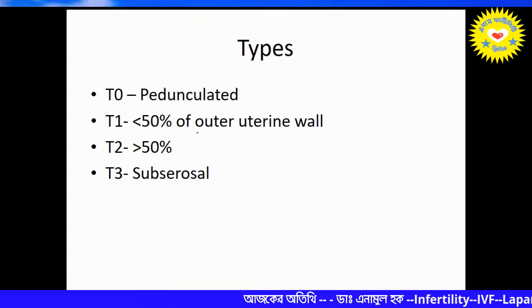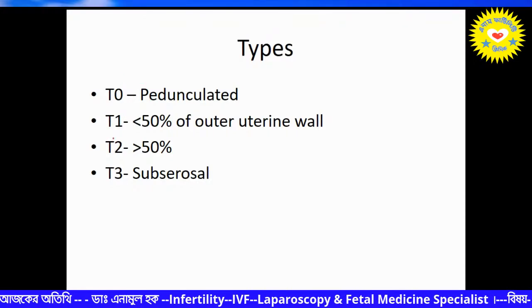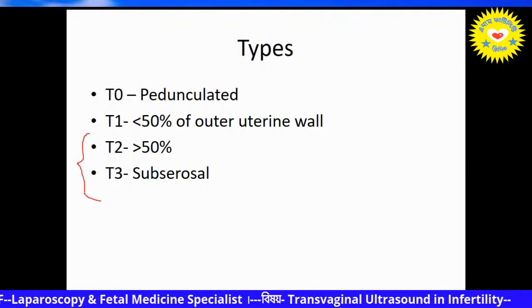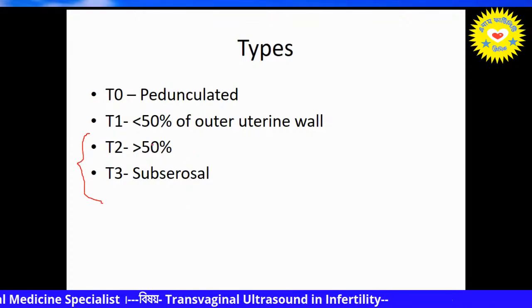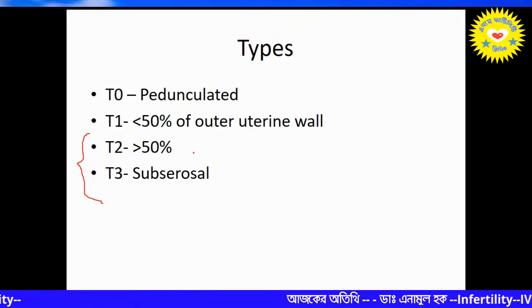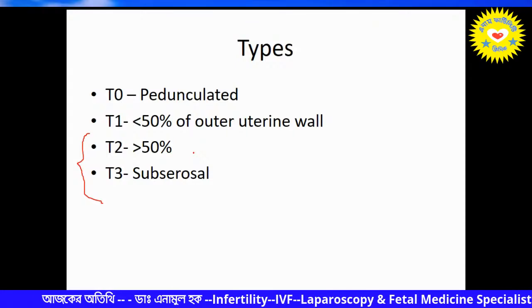Here you see the T0 and T1 you have to manage hysteroscopically, and T2 and T3 you have to manage laparoscopically. So this is very important, that we can diagnose only by hysterocontrast sonography, the saline infusion sonography, and with the 3D help.